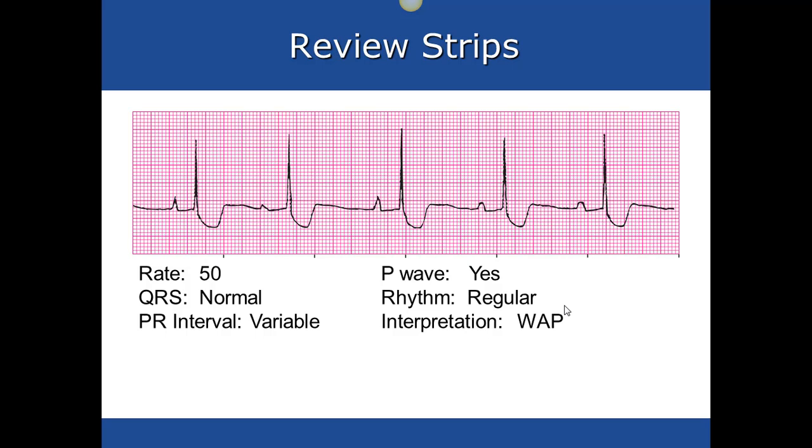All right, on this next one, pause the video, watch it, see what you can come up with, and then I'll be right back to help walk you through it.